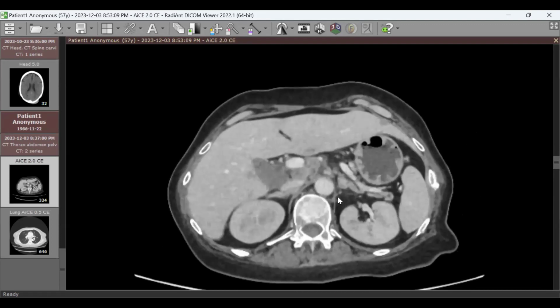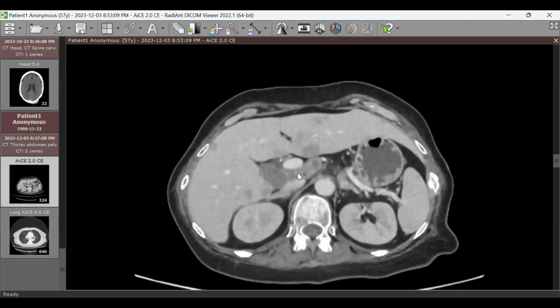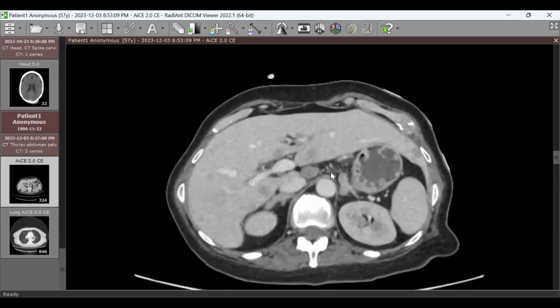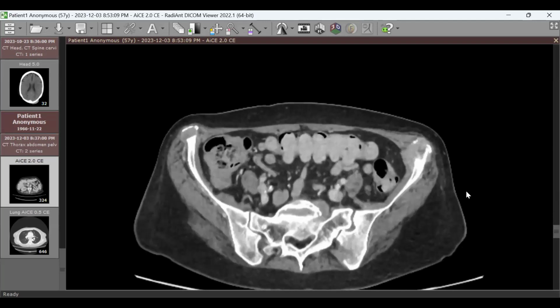Yes. What do you call them? This one here is the inferior vena cava. This is the portal vein. This is the inferior vena cava, right? Porta cava lymph node. Yes. Okay. Porta hepatis lymph node. Peripancreatic. Good. And also lesions here. So now you provide.